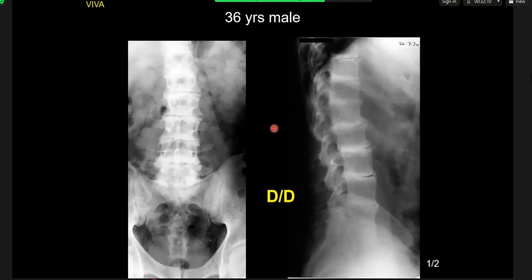Okay, so this is an X-ray of the lumbar spine, AP and lateral views. There is abnormality involving almost all the vertebrae, most significant at the level of the intervertebral discs. Marked sclerosis is seen within the disc and around the superior and inferior end plates, resulting in narrowing of the intervertebral disc and joint spaces. And on the AP film, there is... Anything here? What is this where I'm pointing? What is here?